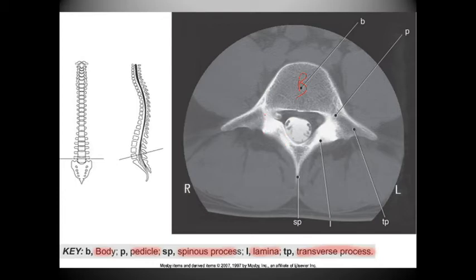This is pedicle, this is the lamina. Spinous process, transverse process, contrast in probably the subarachnoid space, psoas muscle, psoas muscle.